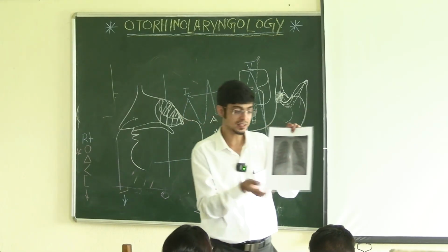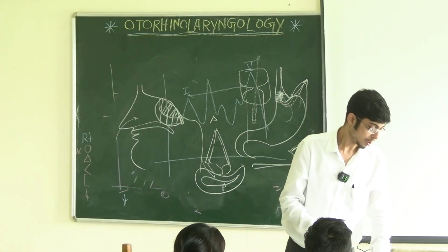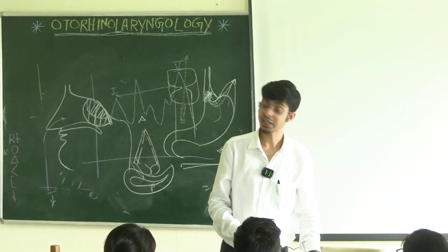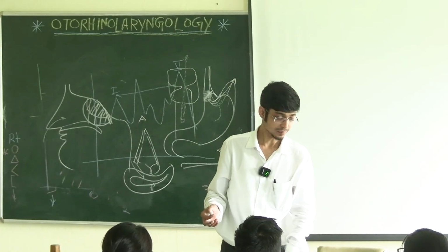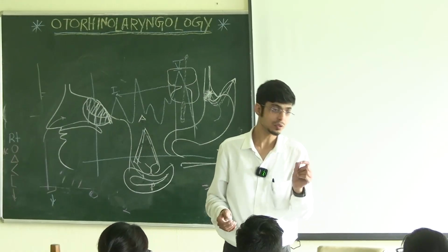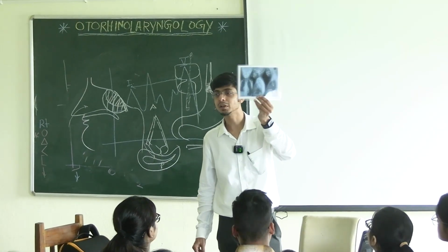A very famous surgeon, I will not name, we have seen taking in a case like this, and the patient had fatal complications because he developed severe mediastinitis. So emergency things can happen. It was a battery that the patient took. That's what I was talking about. We have an X-ray of that. See, this is an LED bulb.